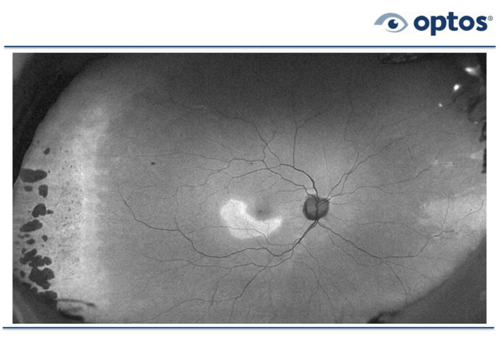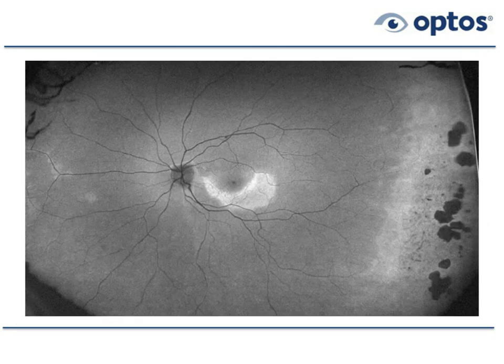Now, typically when we talk about RP, we talk about lesions that start in the mid-periphery. We see a bunch that start in the mid-periphery, but we also see several, more than just 1 or 2, probably maybe 6 or 7 I can think about, where the lesions are in the far periphery and in the macula. And the mid-periphery actually looks okay. In order to convince you that this is an abnormality like retinitis pigmentosa, you're going to want to see symmetry in the other eye. And there's really beautiful symmetry between the 2 eyes.